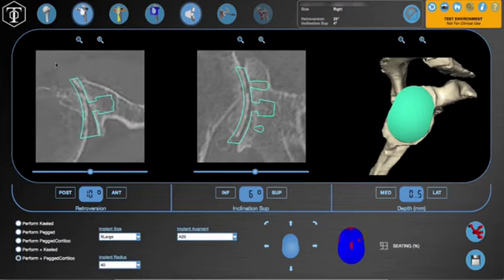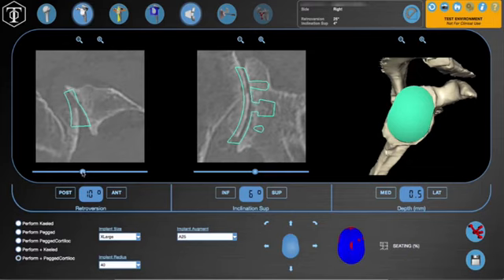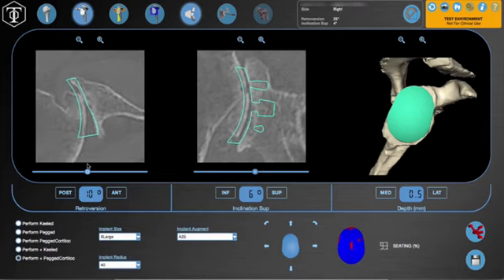One thing you'll notice is that this anterior osteophyte, which I think is mainly osteophyte or ossified labrum, is going to get reamed pretty aggressively, which I think is adequate because it's not necessarily a huge supporting structure for this glenoid implant itself. So now that I changed that implant augment to 25 degrees, I do think that there's quite a bit more seating posteriorly on the native glenoid with really not too much aggressive reaming of the subchondral plate. You can see that implant sitting quite nicely here.